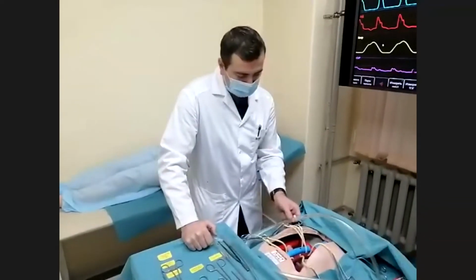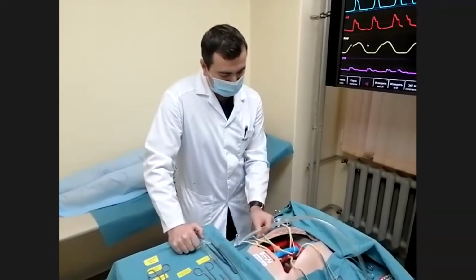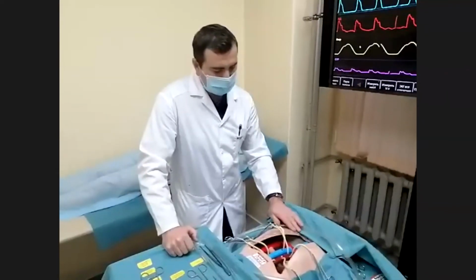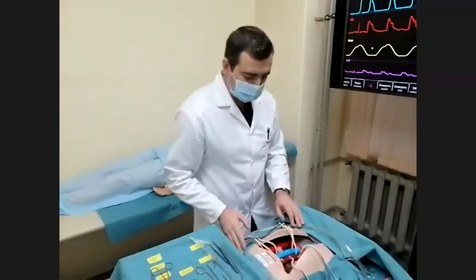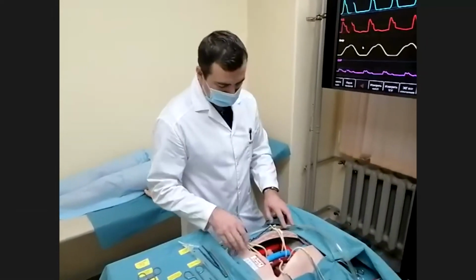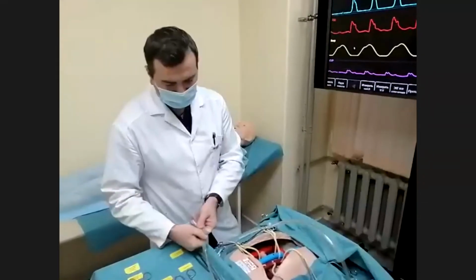So, bottom line, there is no connectivity between the software and the hardware in this case. It has to be an experienced operator who is doing visual control of what the trainee or the person being examined is doing on the simulator or the task trainer in this case, and he will adjust some of the parameters. Basically almost like our lab vision hybrid simulator, which also requires 2 skilled operators to operate.